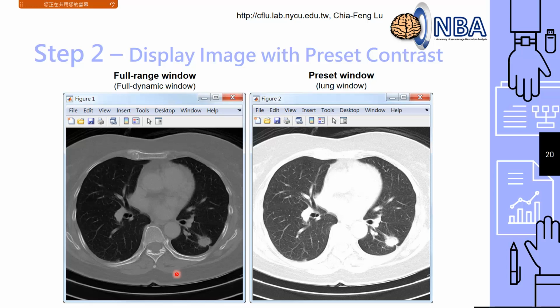When I say please focus on me, that means I am asking you to ignore your classmates, what they are talking about or what the TA is talking about, because I say focus on me, right? Now, how about we focus on the lung region? We don't care about the heart. We don't care about the rib. We don't care about any bone or even fat surrounding the rib, okay? We don't care about them.